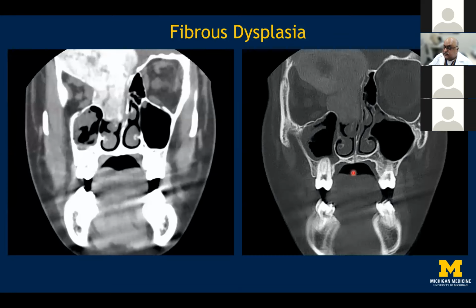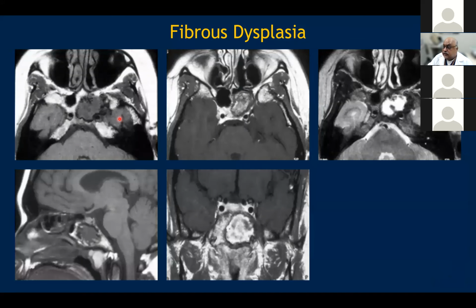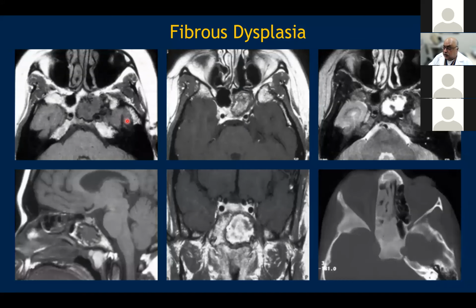The fibrous dysplasia lesions are commonplace and should always be addressed and looked after. And you can see for yourself that there is this ground glass material, which is so characteristic of this lesion. It has many features to it, and the other aspect is that it contains more of a fibrous material than the osseous, which appears to be iso-intense on the pre-contrast T1 and shows typical heterogeneous enhancement following administration of intravenous contrast.